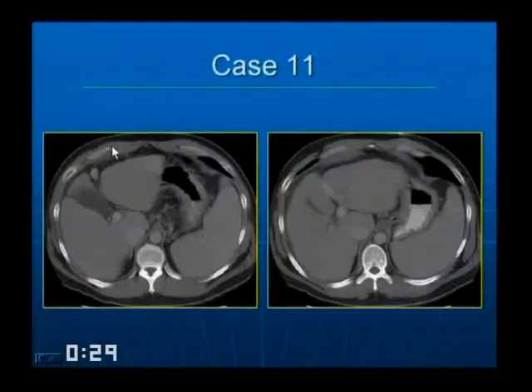The patient has the other signs of cirrhosis: small, shrunken liver, relative hypertrophy of the lateral segment of the left lobe and sparing of the caudate lobe, and with a somewhat nodular surface to the liver. The proper term for this, by the way, is a patent paraumbilical vein. We used to call it patent umbilical vein. It's not recanalization. There's another term in the literature. The umbilical vein does not recanalize. It's a collateral formation.